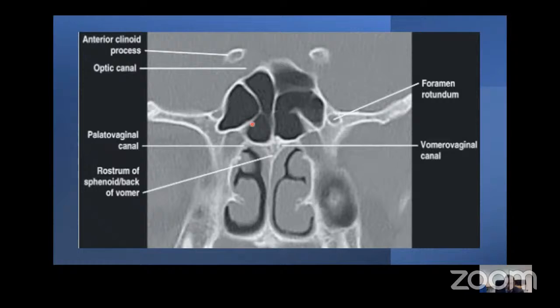Now let us focus our attention to the sphenoid sinus. Here we can see a sphenoid sinus which is well pneumatized. We can see a septum almost in the midline. On the right side, we can see the septations going laterally, and watch out for these because they can get attached to the internal carotid artery. On the left side, the septation is incomplete.